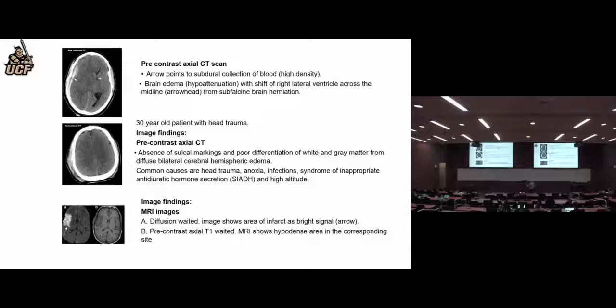But the other thing, actually, the best way to notice it on this one is that ordinarily a brain has sort of like sulcal markings, the sulci, the indentations. But if the brain is really swollen, you can see it just sort of flat against the skull. There's not many markings here. And there's the same thing here. It's swollen here, it's pushed over. You don't see many markings.